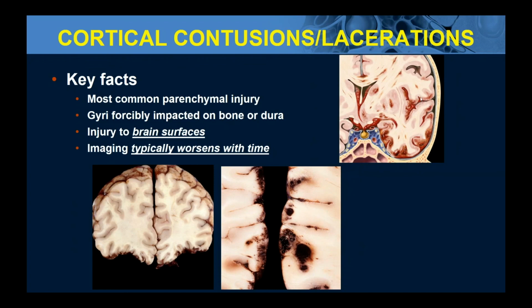They're often accompanied by traumatic subarachnoid hemorrhage, as we see here. And here, if you look at the autopsy case on your lower left, this is a coronal section. The orbits are down here where I'm moving my mouse, and then these are the brain bruises in the brain right over the bony roof of the orbit.